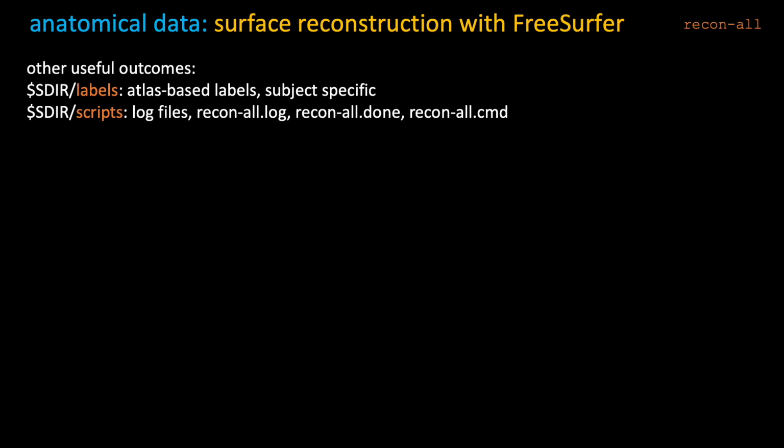There's also a directory with scripts, which basically includes all the log files. There's a record of all the commands that were run. There's a record of all the outputs of these commands. So if you run recon-all, go away for 6 hours or whatever it takes on your setup to run, and something crashes, this is the place to look, find the last command that was run, see what went wrong.